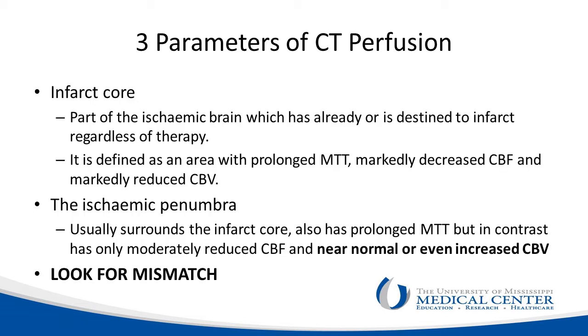The core of the infarct is going to go on to encephalomalacia regardless of the therapy, and that's going to be defined as having a prolonged mean transit time, a decreased cerebral blood flow, and a decreased cerebral blood volume.